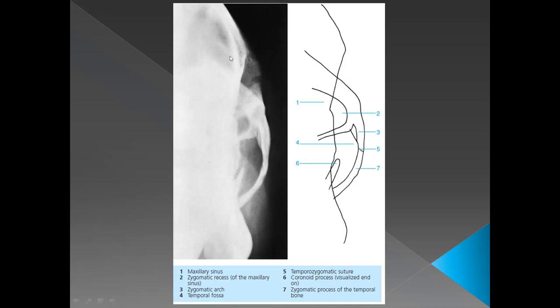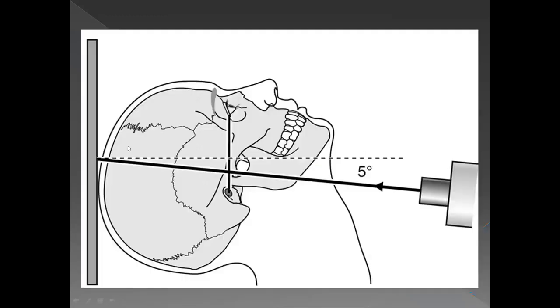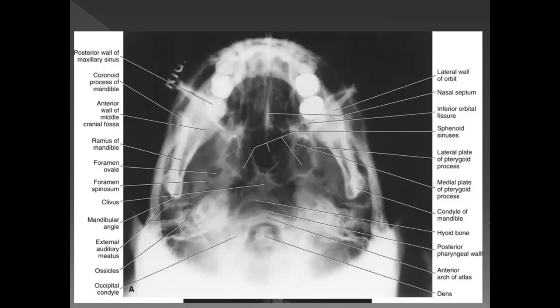All right. And let me just show you an overexposed X-ray, how it will look. Hang on. This is an overexposed X-ray. All right. So see, this is overall looking a lot darker as compared to that one. So overexposed means more dark, and if it is underexposed, it is more white.